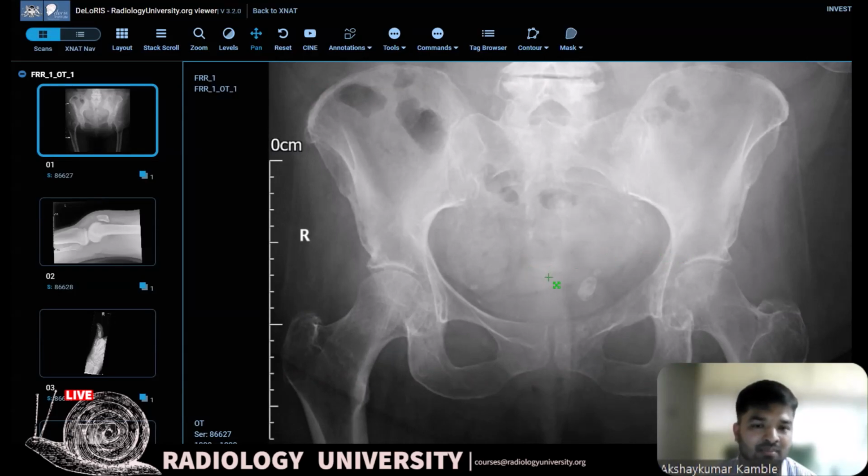But what I would say is, in rapids you won't have something subtle. It has to be very unambiguous. For example, if you show this to 10 radiologists, 9 out of 10 should say that it exists. And we have almost 10 people here, so how many of you think that's pathological? You know what I'm trying to say. That's how you judge when you're writing a rapid: is it something only I'm picking, or something going to be picked up by most of them?